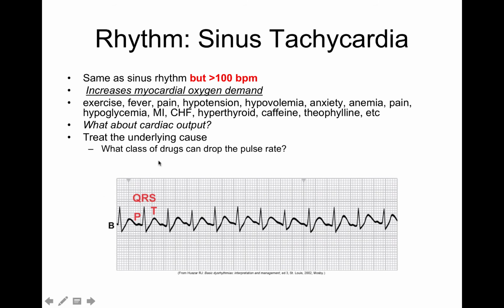I'm going to map from each R wave and see the distance, okay? So even though it's a tachycardic rhythm, the distance should remain the same if it's consistent.